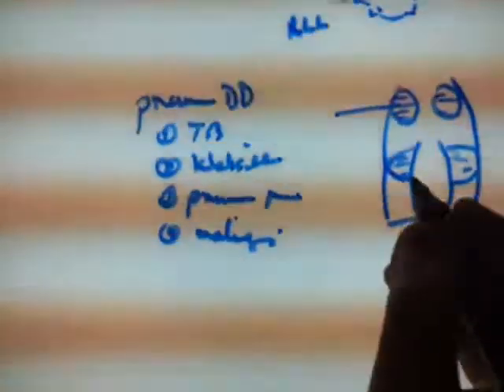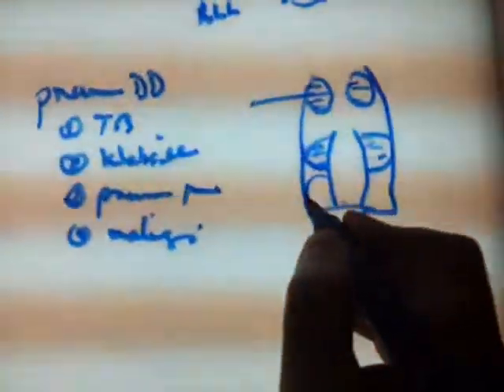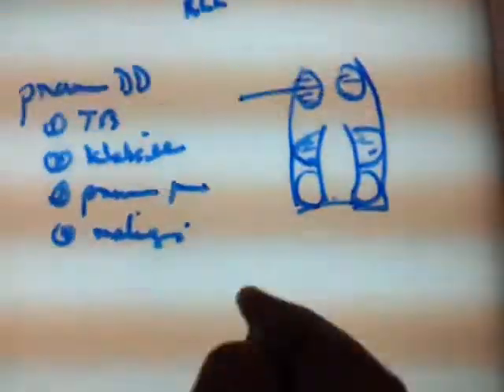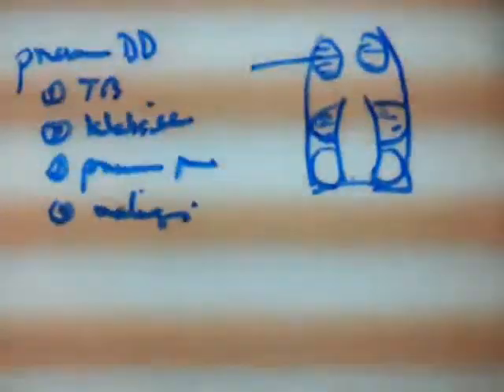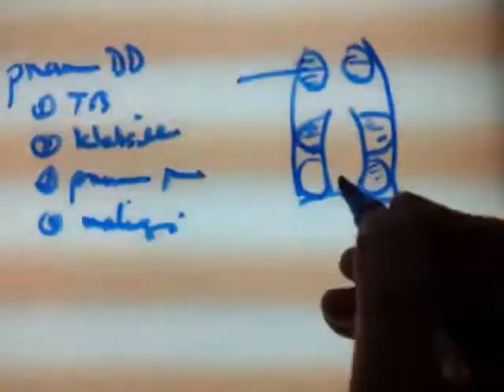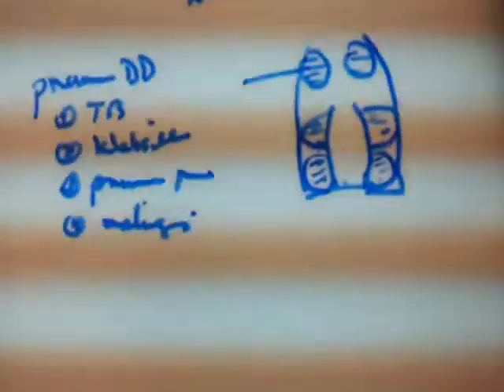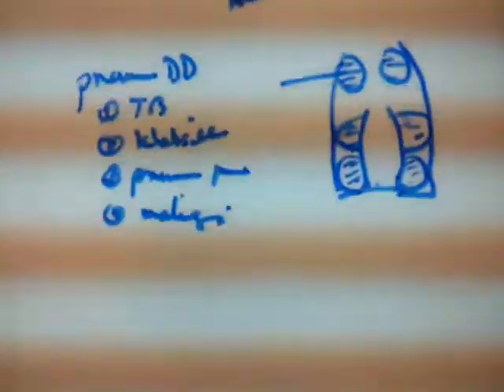Okay. Any pneumonia occurring in the lower part, if it is unilateral, could be pneumococcal pneumonia, could be tuberculous pneumonia, could be Legionella pneumonia. But Legionella pneumonia is usually on both sides, and it affects the lower lobes, and the patient is seriously ill. There are multi-organ symptoms and signs. The patient with Legionella gets what?